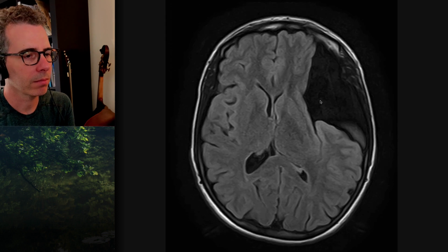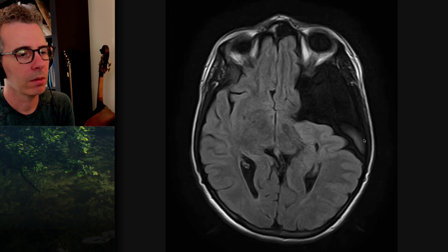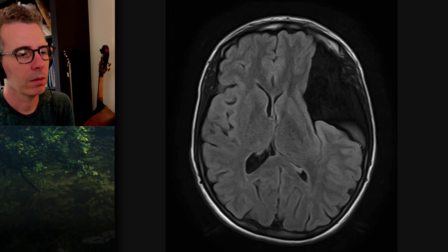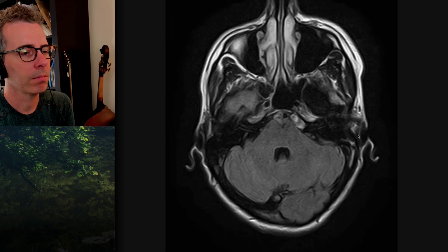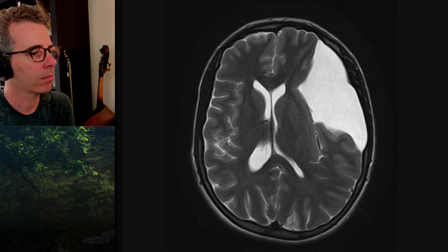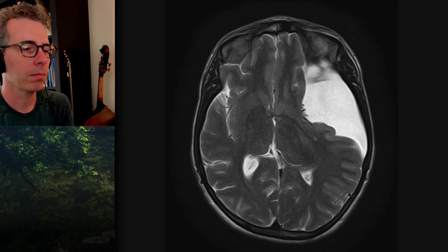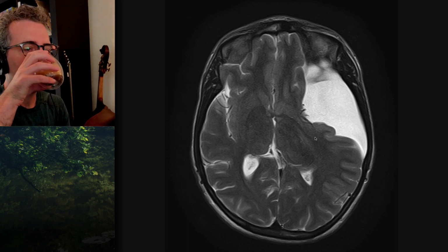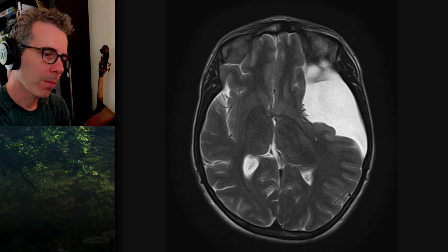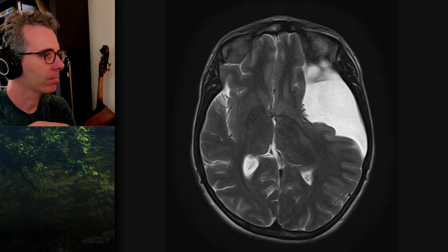Completely? Yes. Actually, what about posteriorly? Yeah, there's a small ovoid area posteriorly that doesn't suppress. Yep. But this doesn't correspond to... There's a small area on T2, there is a small region of iso-intensity relative to grey matter within this area of non-FLAIR suppression.